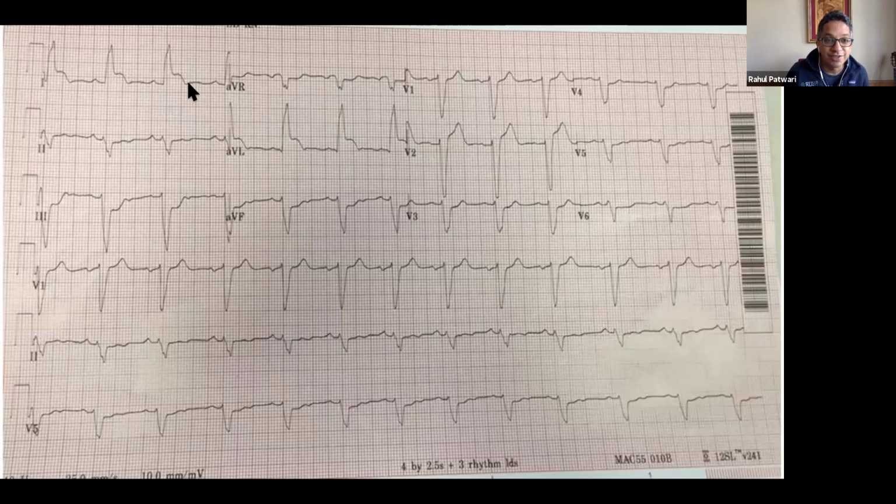Positive concordance, where you can see, we never see this, right? This should just look abnormal to you. I never see a bundle branch block that has this kind of weird morphology, where there's that concordance there. And so that is something that should worry you. And you can even see here the negative concordance in these leads. And so that is how we can look for occlusion MI in an EKG in somebody who has a left bundle branch block or paced rhythms. And of course, the always good rule is when in doubt, get a second EKG.